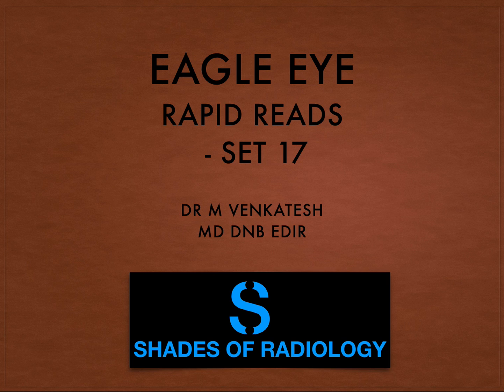Today let us see the rapid read set 17. I made these as eagle eye spotters because it's a little bit difficult to identify the lesion location itself. So try to carefully assess. You can pause the video and you can see the image. You can assess for yourself and try to identify the lesion first.